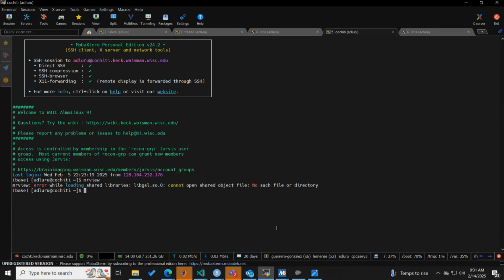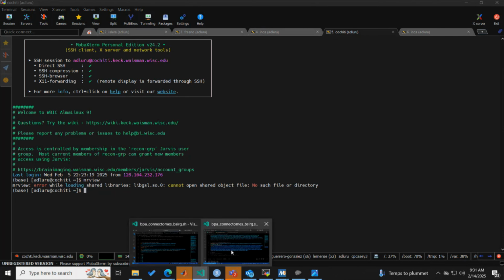If you have a Mac, Parallel will work on Mac, but you won't have Condor. That's okay. This should be quick, right? I mean, you saw, but I don't know if Parallel. What I'm also wondering is if Parallel would interfere, like if I tried multiple windows at the same time. It actually depends on the viewer. When I tried with FSLeyes, it's okay. But when I tried with MRICroGL, it didn't work. I don't think I tried with mrview, but you could give it a shot. I think it will work because mrview is more sophisticated in the graphics.